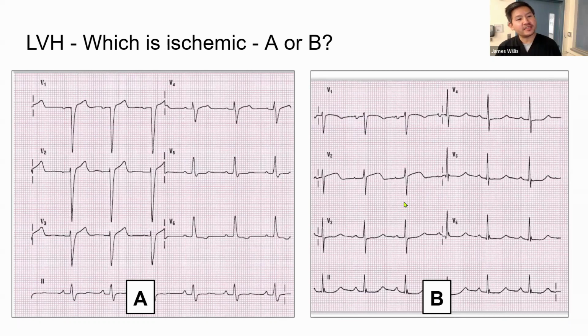What do you guys think about this? Someone said B. B. What's going on with B? Yeah. What about the morphology?